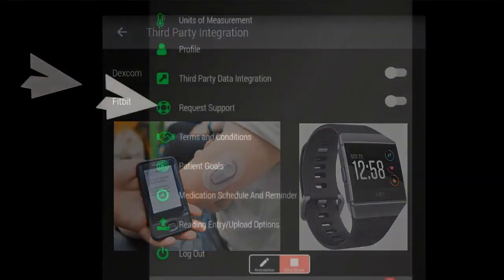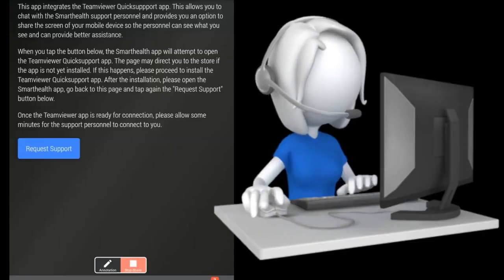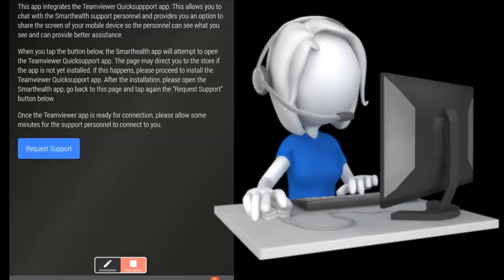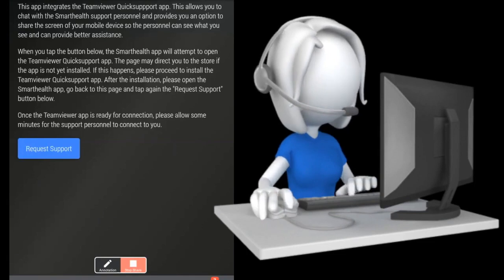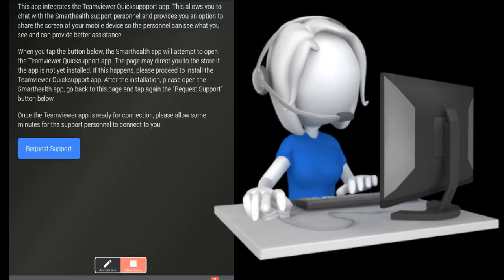Also included in our app is online support created to eliminate any confusion during the learning curve. The user simply clicks on Options and selects Support. Our support center can educate the user or troubleshoot the problem verbally or use our popular screen sharing technology, giving our support center the access to view what the patient is seeing and also giving us the capability of taking over control of the screen and showing the user what to do.